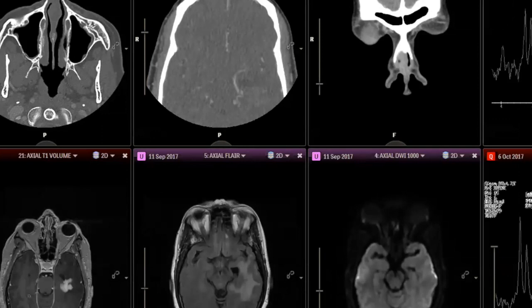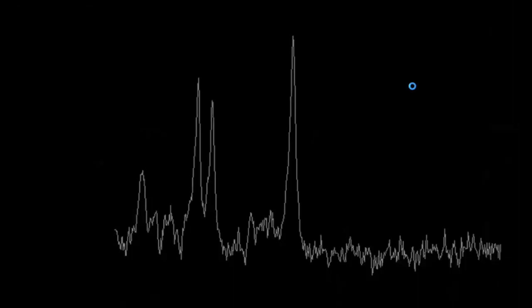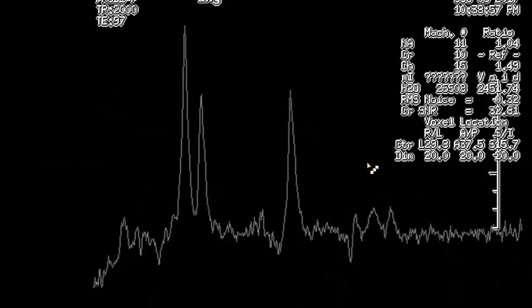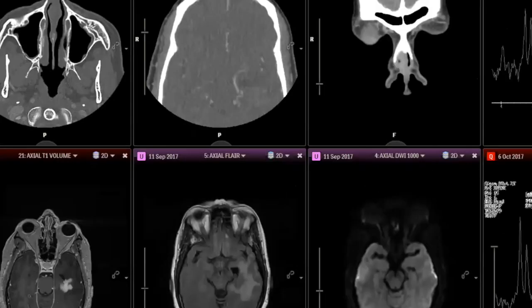And interestingly, we did get an MR spectroscopy, and this just proves my theory about MR spectroscopy, that it can be positive in everything and nothing. This is a case of a spectro which shows that the choline was high on the left side compared to the normal side, and the NAA was low. So, sarcoid is the great mimic.